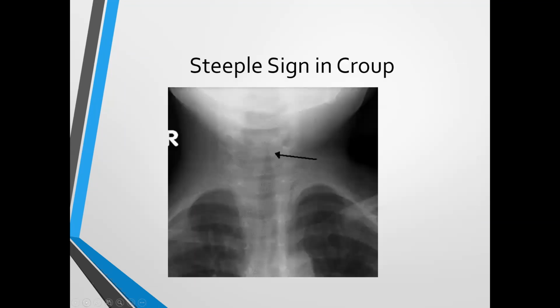Now let's just transgress a little bit. I know this presentation is mainly on chest imaging, so I'm being sneaky here, okay? Because many times when they're doing a chest X-ray, they're also getting the trachea. And in the normal chest X-ray that I showed you earlier, we're actually looking at the trachea, okay?